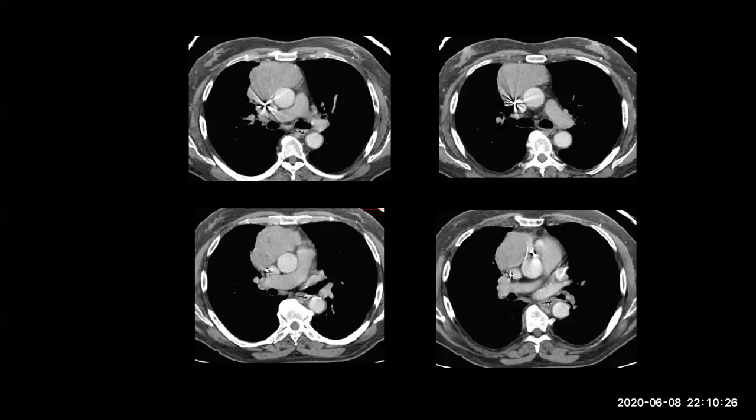Homogeneous, retrosternal space. We see a mass lesion in the anterior mediastinum, enhancing. This is a CT scan. Lobulated, yes, and it is across the midline. What question should you ask now?